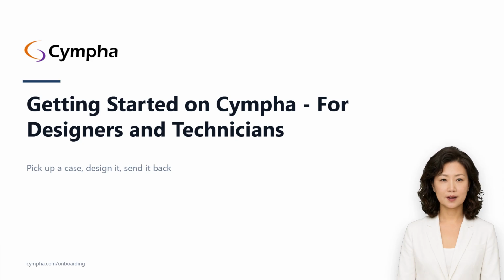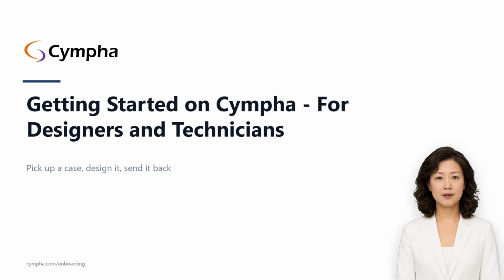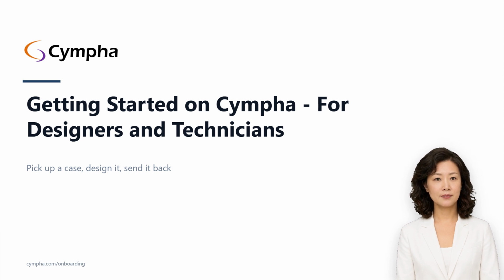Her lab manager has just assigned her the implant case Dr. Amara submitted, and she is going to design the surgical guide and send it back for approval. The theme running through all of this, Cympha moves files, it does not tell you which software to open. Where you design stays your decision.